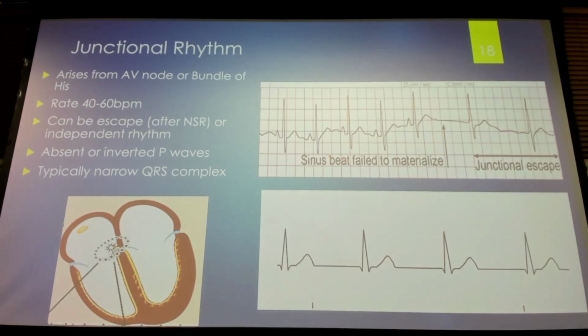And what that is, you have a PQRST that comes all the way through, looks pretty regular, and then you have this pause. And that pause is just enough for the heart to say, well, wait a minute, what's going on? Something else needs to fire. And if the atria don't fire, then the junction area is going to immediately take over. You do the overdrive suppression.